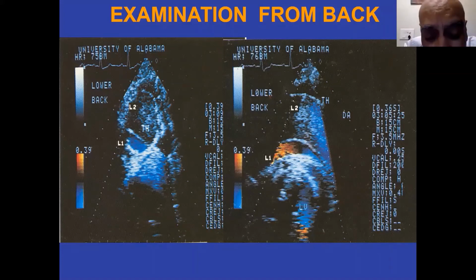Yeah, very important. Normally, if you want to look for the apical four-chamber view, one of the prerequisites is that it should be straight and not off-axis. If you want to observe the left ventricular wall motion and function, and estimate the volumes, you should always have a straight view. The off-axis views are not good for wall motion. You should never comment on the wall motion from the off-axis view, and you should always try to get straight views.